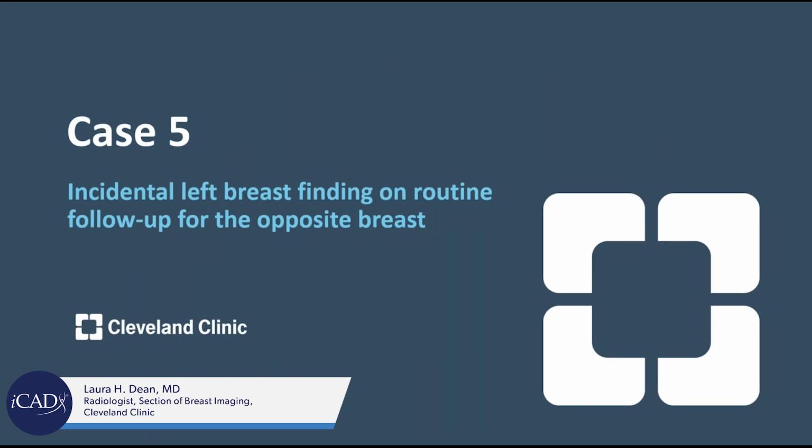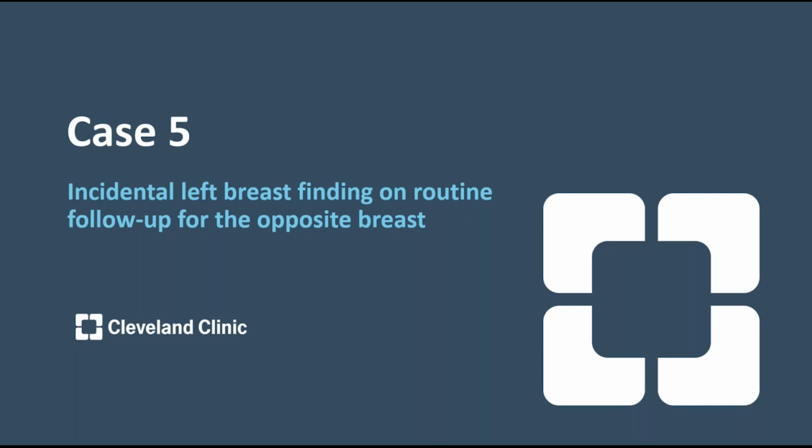And finally, this is our last case, the last one that I wanted to show you today. This is for an incidental left breast finding that was found on routine follow-up for the opposite breast. This is similar, if you remember, to case one, a very similar presentation where a patient came in for a follow-up on the other side. We end up finding a very small, subtle abnormality on the contralateral breast.